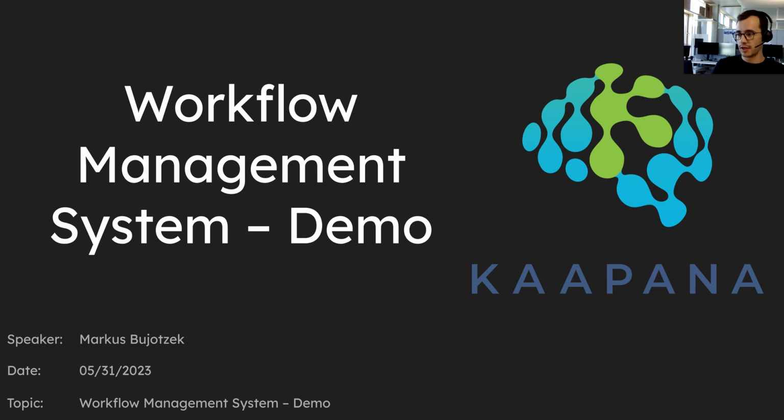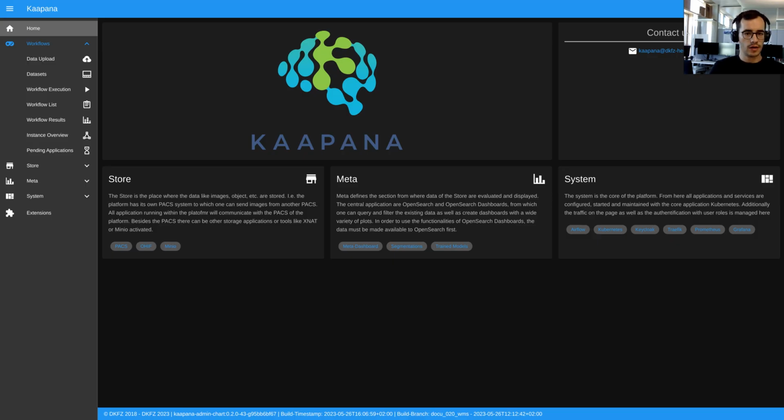Since this is a demo, let's take a look into our Kaapana platform. Here at our Kaapana platform, the workflow management system consists, in the left-hand side's menu, of the workflow execution component, the workflow list, the workflow results, and the instance overview. Let's start by taking a look into the workflow execution component.